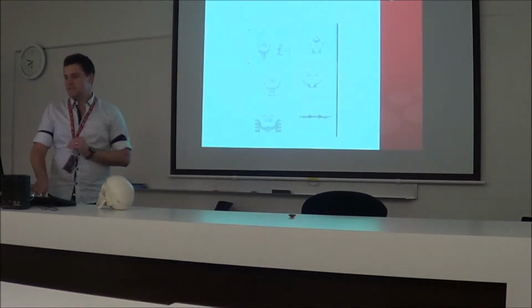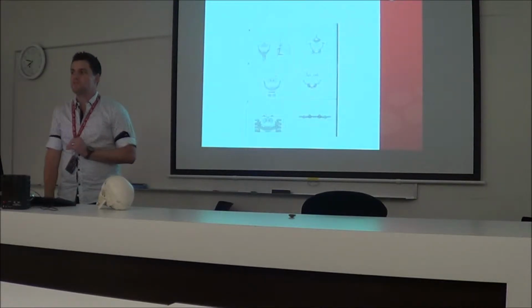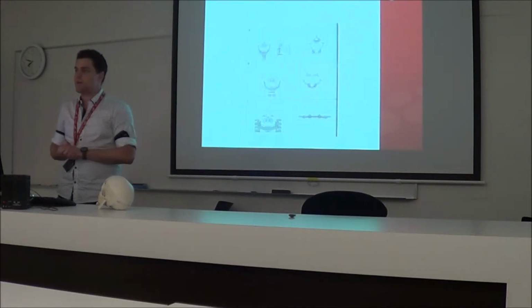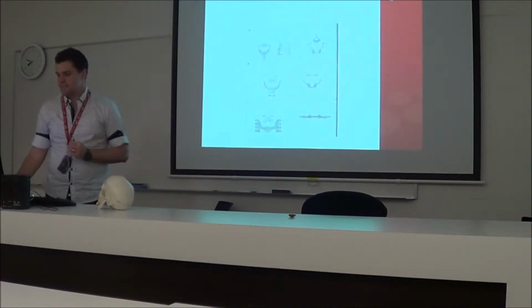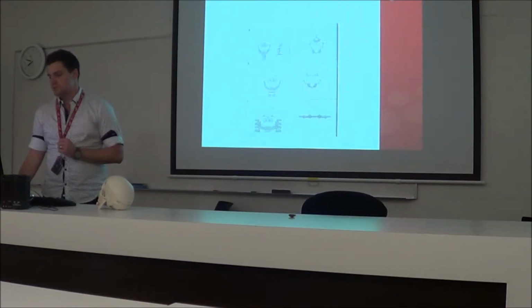So the first thing we're going to start to have a look at is a patient being too far forward in the machine. There's three hallmarks of these images. So first of all, what you're going to see is on this little image here, we've got our little triangles. You might remember on the previous presentation, I was calling these little areas the distal triangles and this area the anterior zone. And I was talking about how when the images fold out, we start to get some structures appearing.